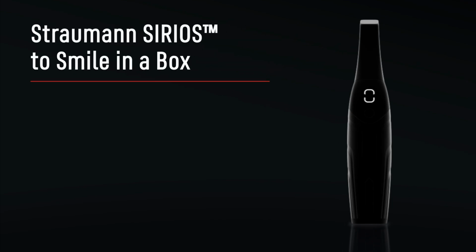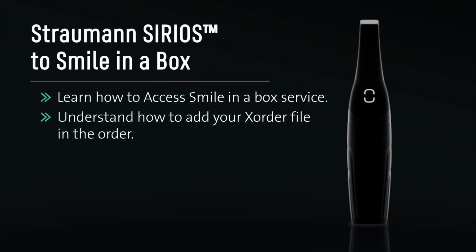Straumann SIRIOS to Smile in a Box. Learn how to access Smile in a Box service. Understand how to add your X-order file in the order.